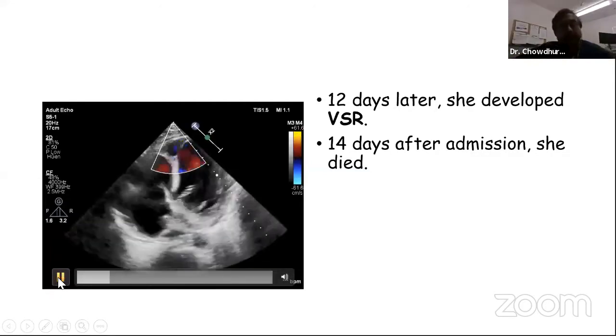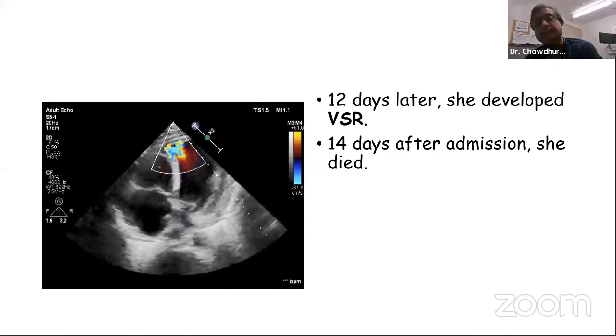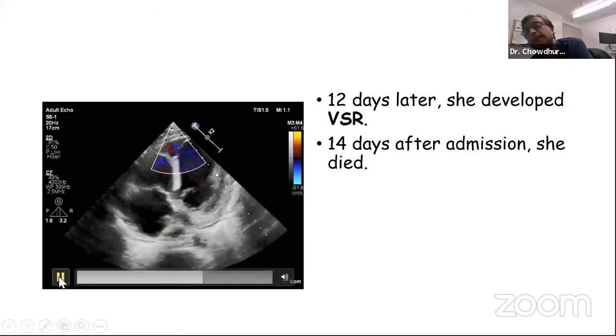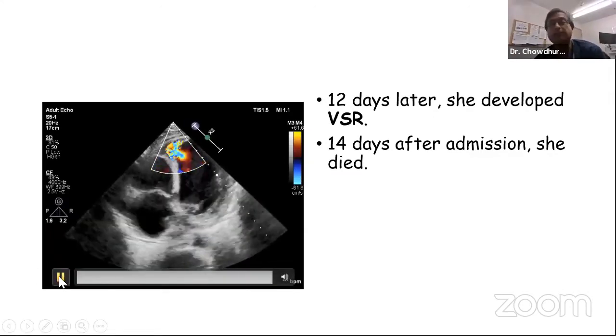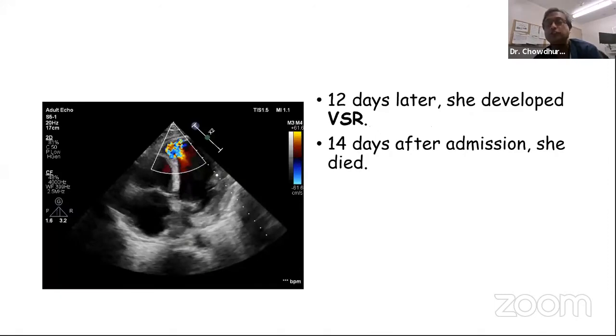So, Rafiq bhai, this is the apical septum. If you are showing me anterolateral and then apical septum, and this is a delayed and non-reperfused MI, this is post-MI. Yes. The post-MI VSD, apical VSD, is actually relatively easier for the surgeon to repair, but we, the interventionalists, know how the surgeons feel. They say hemodynamically stable. The problem is you will not be able to get hemodynamically stable as they want.